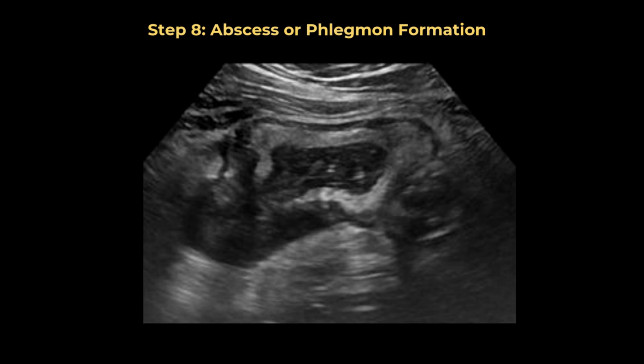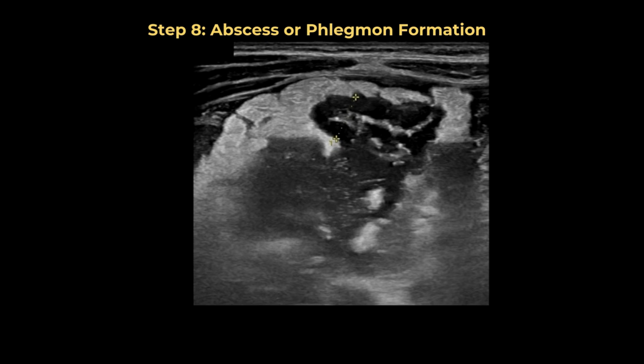On ultrasound, an abscess appears as a complex fluid collection. Unlike a simple cyst, it is not black. You see low-level grey echoes from pus, debris, and sometimes thin internal septations. Gas-forming bacteria may be present. This creates bright white air foci within the fluid. These produce dirty acoustic shadowing and may form an air fluid level.